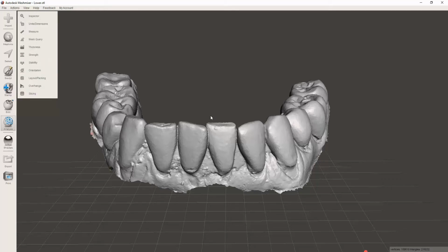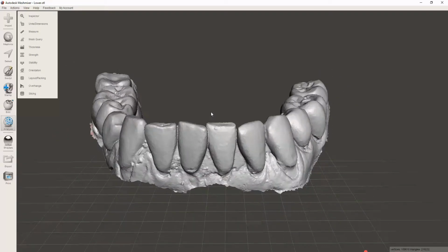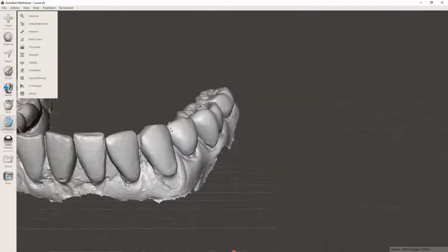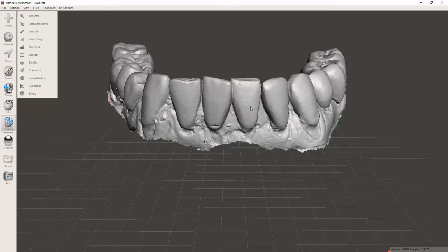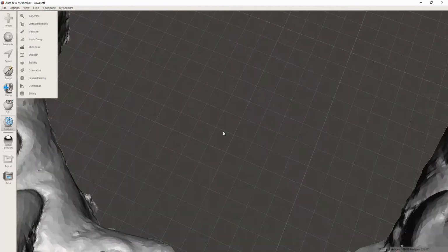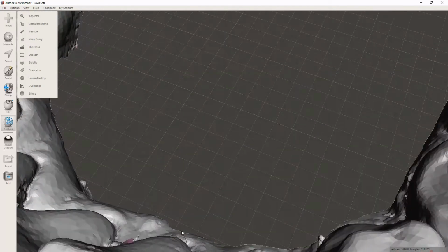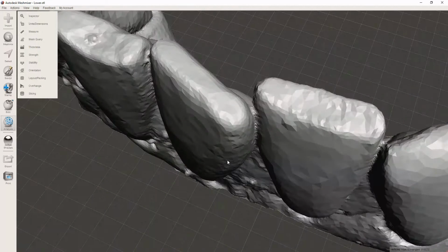And then the wheel button, of course the wheel goes in and out to zoom, but if I press that wheel button, it allows me to do this, to translate around. And that's very helpful, as you'll see. If you can only rotate and zoom in and out, you're going to get into times when you're looking right here and you just can't see this area. But if you just move, you can. Anyway, use an external mouse.